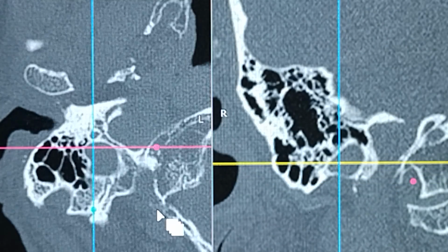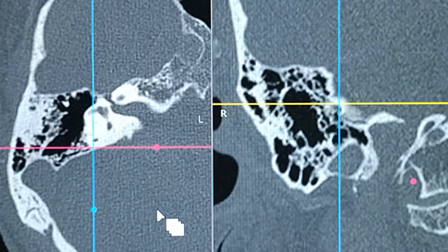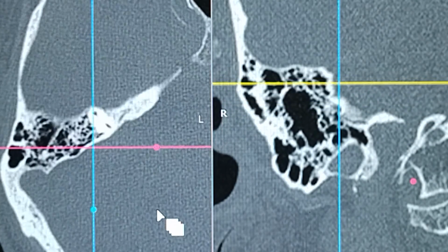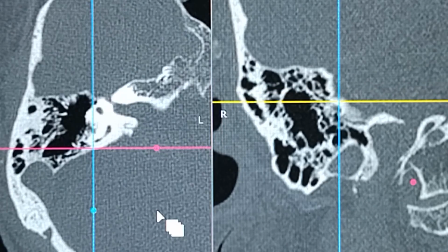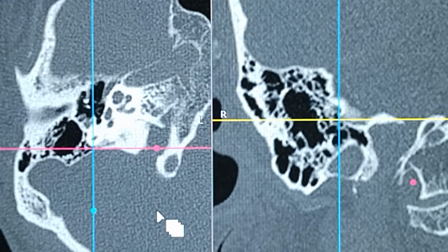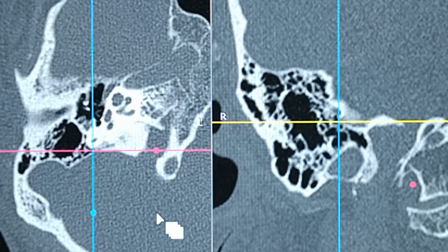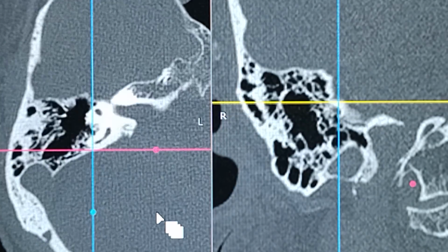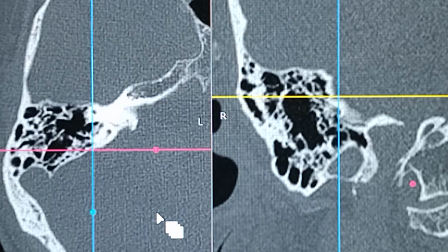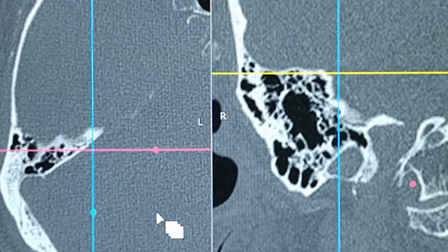Now what is left? I need to see what is left now. So I guess all the anatomy is done basically. The basic anatomy is done. The mastoid we have done, the internal ear, the ossicles, the middle ear, the ESC, the carotid artery, the IJV, the sigmoid sinus. Yes, there's one more point. I need to show the low-lying dura. I need to show you the tegmen tympani, the tegmen mastoidium as well.